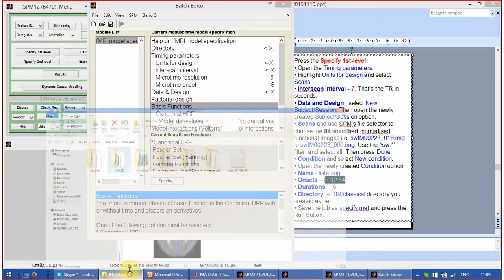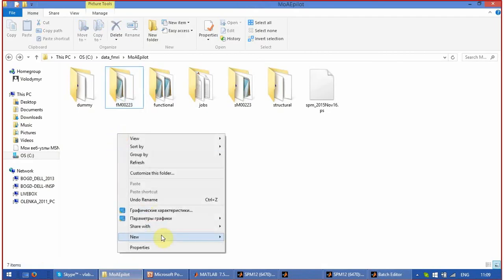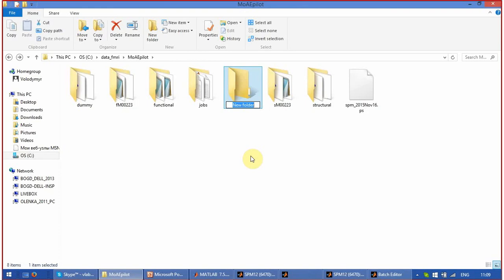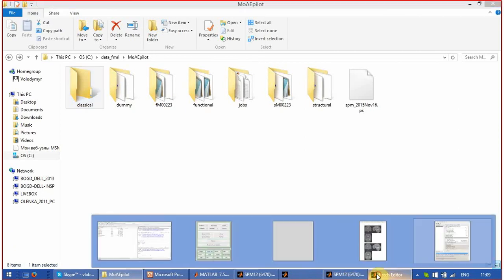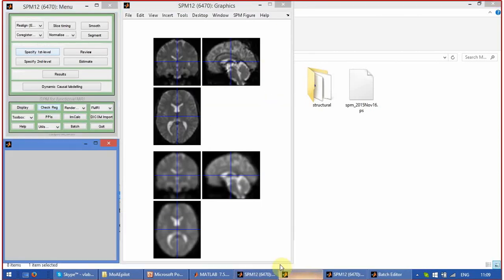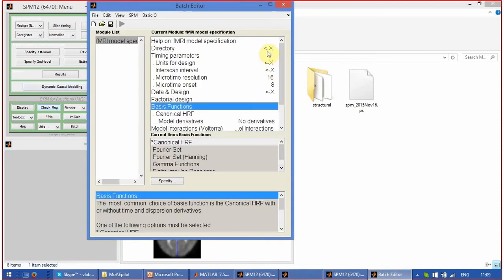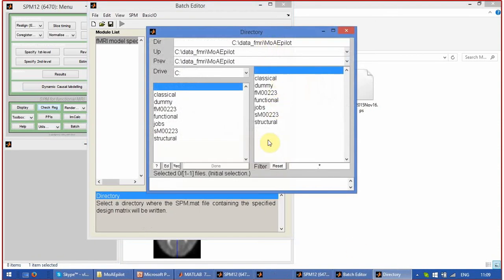The directory is classical, we created in our main directory, and we indicate this directory here, classical.